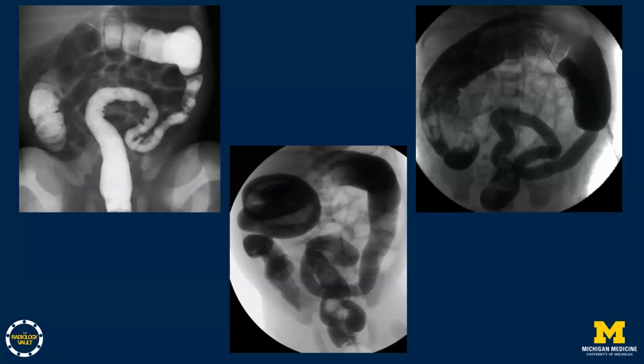Now, one other thing that I'd like to point out is that I have seen patients who have had functional immaturity of the colon that in very premature patients, they actually will have more of what looks like a microcolon, thinking about different diagnostic possibilities. And on subsequent enemas, they then look more like a small left colon and then a normal contrast enema, such that you're watching the development of the colon over time. So keep in mind that in very, very premature infants, you may even see a more proximal small colon, even a microcolon.